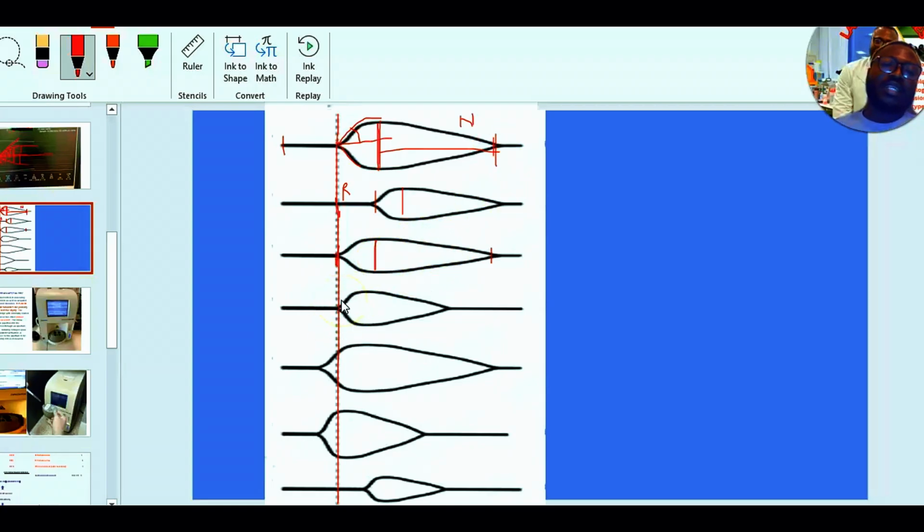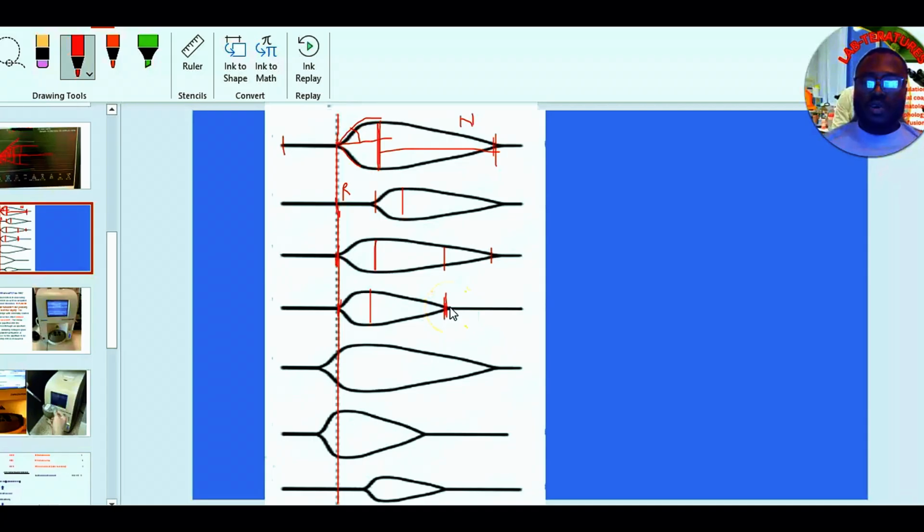Now, when we get to the next graph, you can see the R time is normal. The width of the amplitude is a bit okay. It's better than the one where we had an issue with platelets, though it's not as good as normal. We can say there's a bit of insufficient platelet function here. However, the most conspicuous thing we can see here is that the lysis ended so quickly. Of course, we have a fibrinolysis issue here, because the lysis is occurring so quickly after the maximum amplitude. So in a medical condition of this kind, patients are given tranexamic acid.